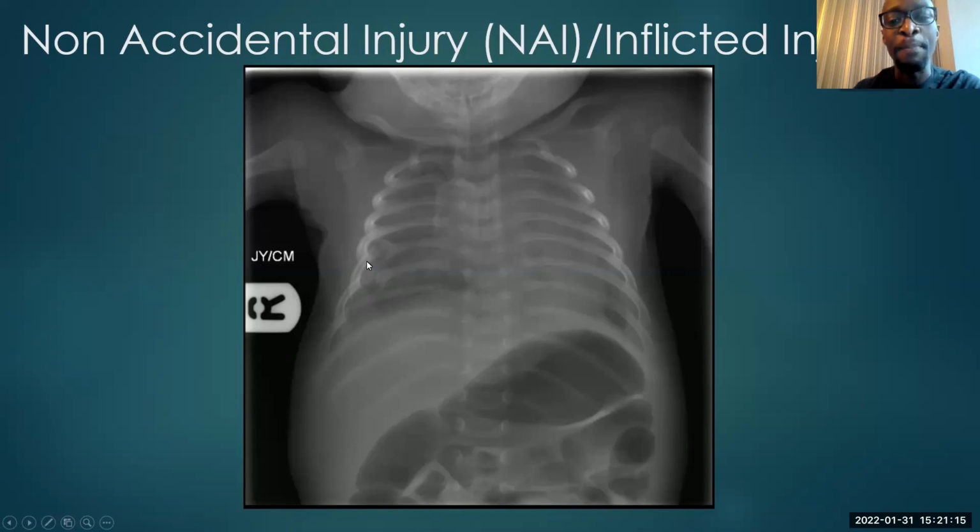So these are posterior rib fractures, and these are both sensitive and specific for not an accidental injury. All the chat's coming through. Yeah, very good. Callus, exactly that. Exactly, very good. Loving it.